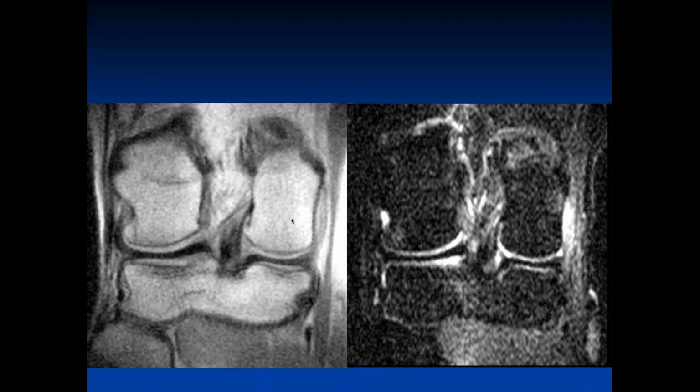Okay, so Jennifer, what do you think of this case? I can see the attachment of the posterior root of the lateral meniscus.